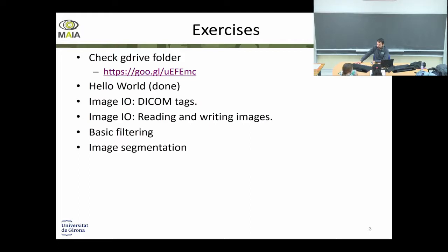Okay? Then image input output, let's say 2, it's for reading and writing different types of images. Okay? If we have time, we will do basic filtering today. So applying one of the filterings to one of the images to remove noise, to enhance edges and different things. And I guess that will be for tomorrow to do some image segmentation. Okay?